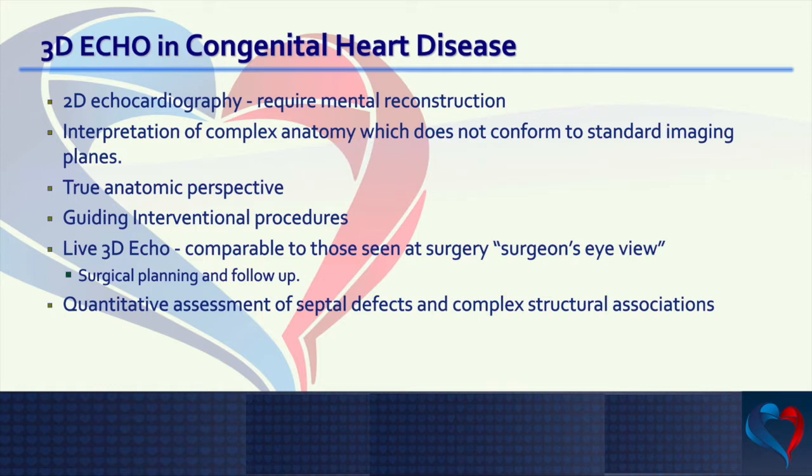Three-dimensional echocardiography gives you a true anatomic perspective, and it's also very important in guiding interventional procedures. Live 3D is comparable to what is seen at surgery, which we call the surgeon's view, which will also help in surgical planning and follow-up. Quantitative assessment of septal defects and complex structural heart disease is feasible by three-dimensional echo.